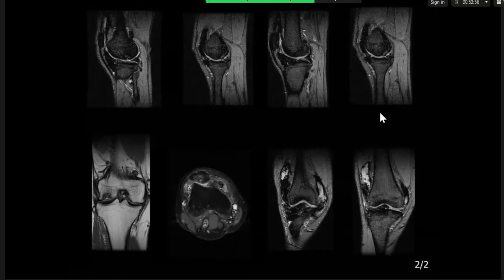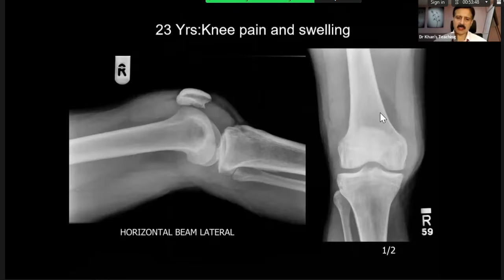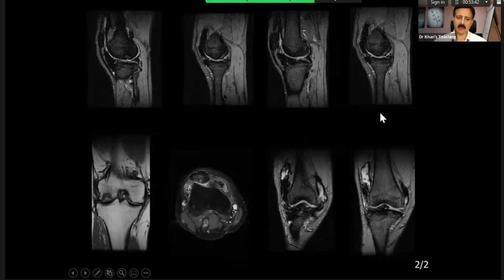either, but it looks lobulated, so it could be PVNS rather than hemarthropathy. Here you are. So this is classical PVNS. You see, the patient has presented with effusion without any reason. And then you have seen this hemosiderin.